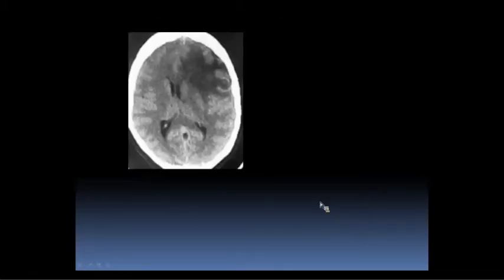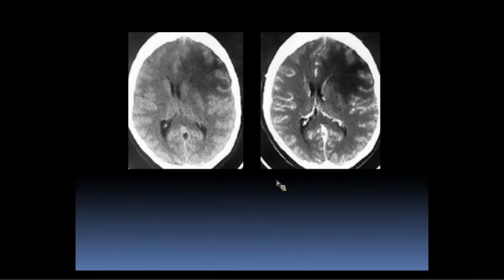So here's another case where we have a non-contrast CT just showing a vasogenic edema pattern. There's clearly some mass effect. There's midline shift. There's effacement of the sulci here. So we're worried about an underlying lesion. Maybe there's an underlying abscess. Maybe there's an underlying met or glioma. And here we give contrast and we see nothing, right? There's no enhancement here. So now what are we thinking?